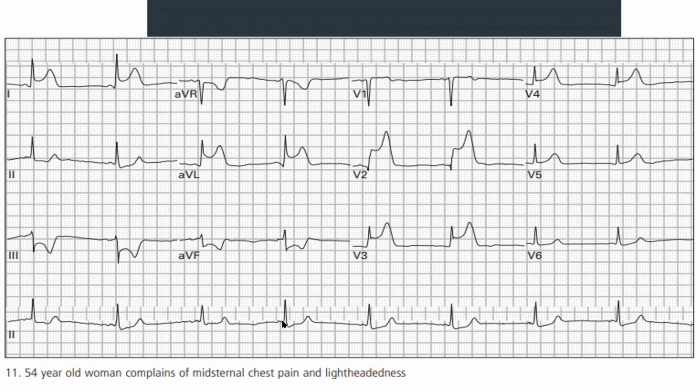Atrial pulsations? You can see them, can't you? But they're very tiny. They're extremely small, actually. They are there. So is that normal? It's not normal. Your P wave should be well defined. You should be able to make them out easily. But at least we can see them. They are there, even though they are small. So already they should start getting your mind thinking, all right, what's going on?